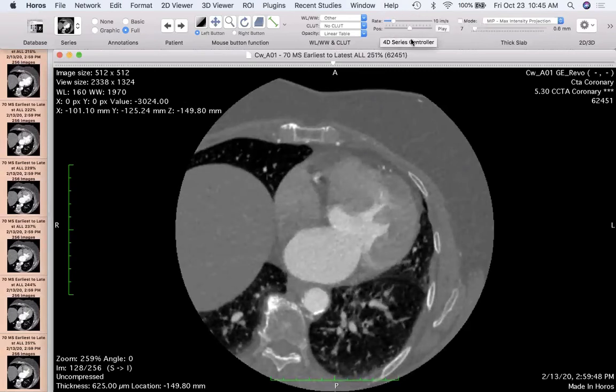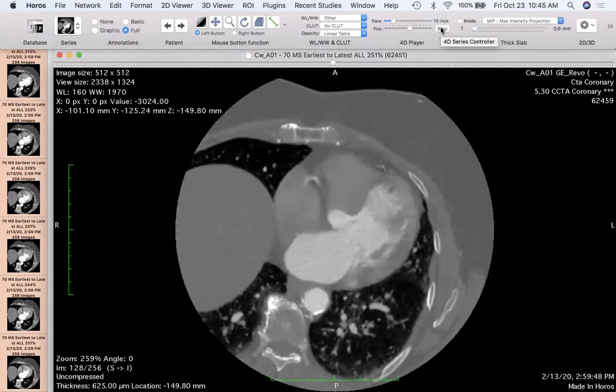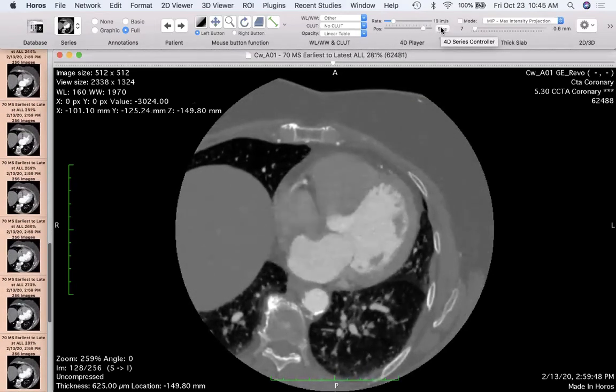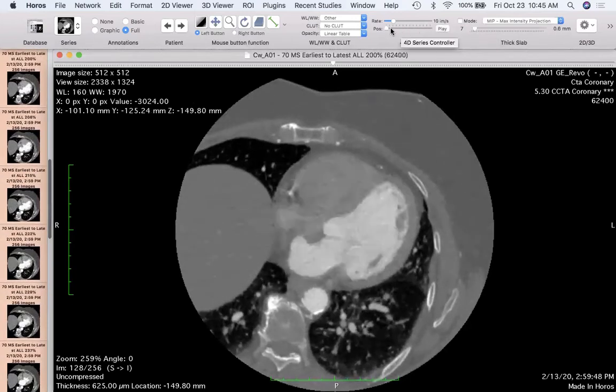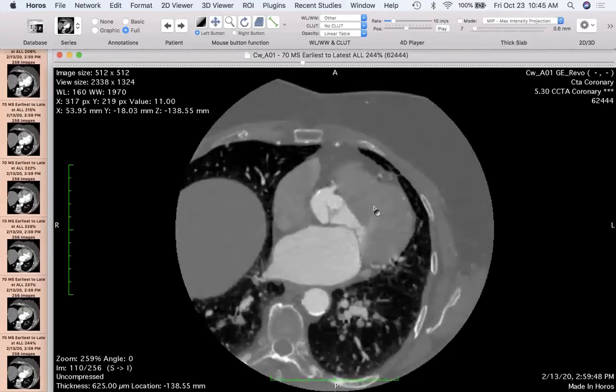If you want to set your view to a specific time frame, you just click this arrow back and forth. You can play that movie I was just doing that way, and then stop it. This is the first, second, third, fourth, fifth, sixth, seventh time frame here, right? So we'll look at the seventh time frame there.